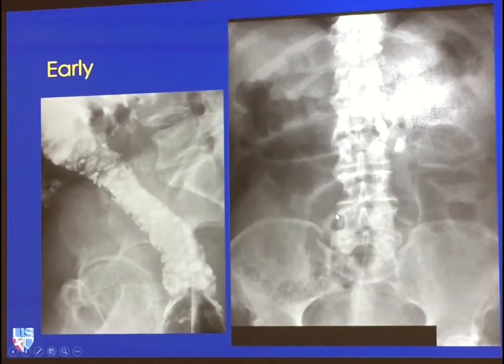In the absence of contrast, when we're relying on our radiographs, you can see these guys here. These are like big, chubby thumbs, kind of smushed down on the plain film, looking like edematous folds.